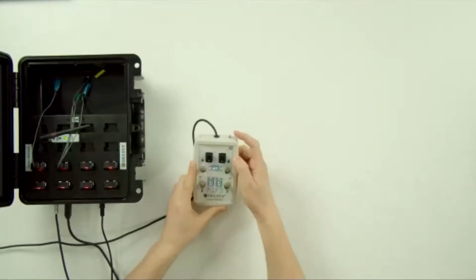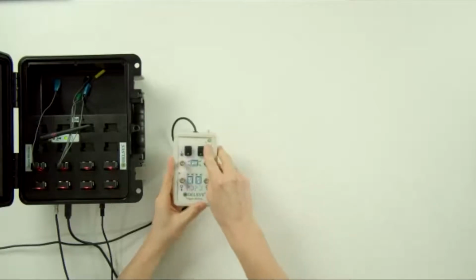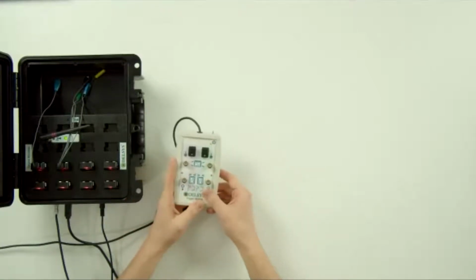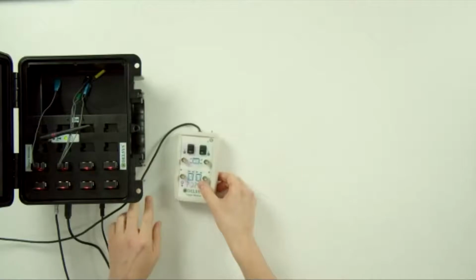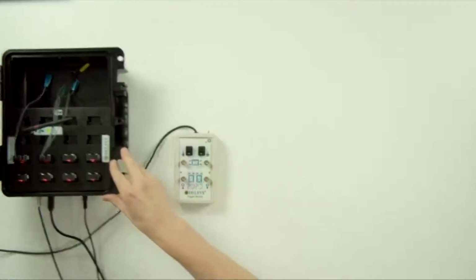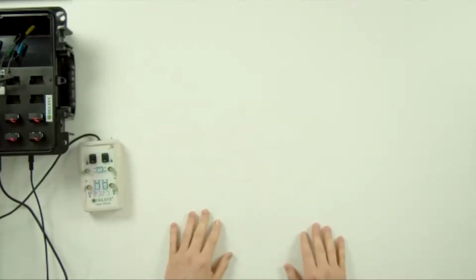The trigger module has an on-off switch at the top, a little flick switch, and you should see a little green indicator in the top corner, which might be difficult to see on the camera, but it's illuminated, meaning that it's getting power from the Trigno base station. At this point, this is largely all the hardware setup we need to do from a Delsys side. So we're just going to move this out of the way and now move on to the Qualisys setup.